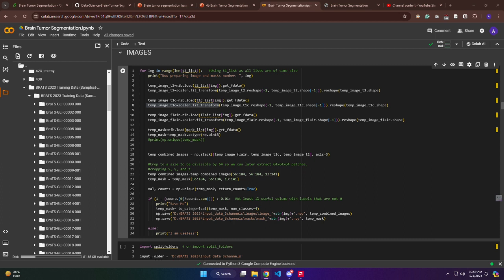To initialize the scaler, we have to create a scaler object instance, which is what we have implemented here. Finally, fit_transform is a convenience method that both fits the scaler to the data and transforms the data in a single step.